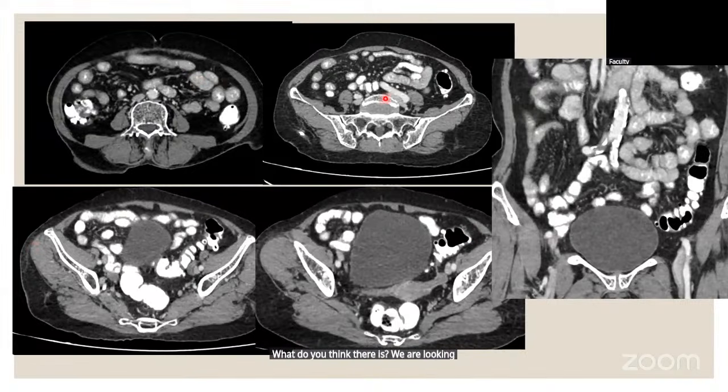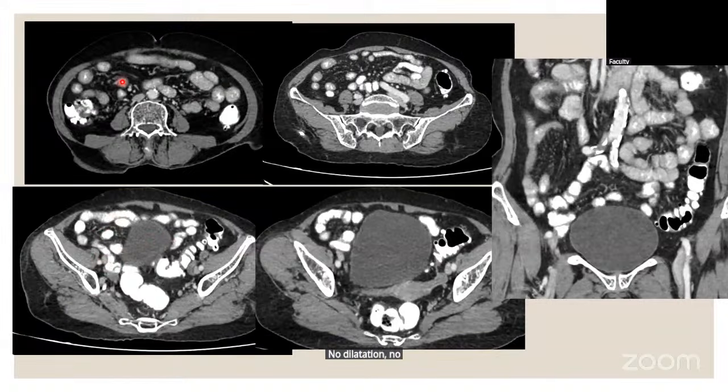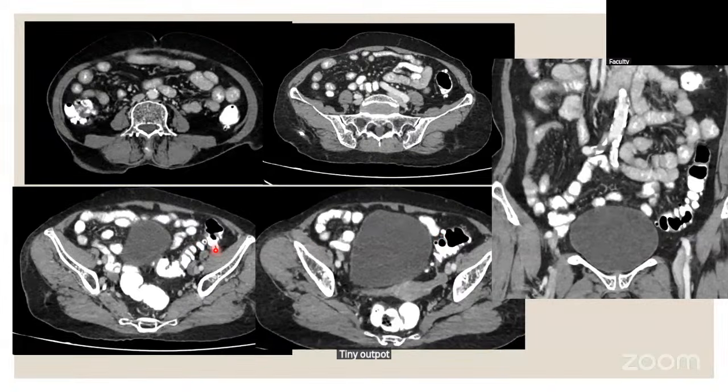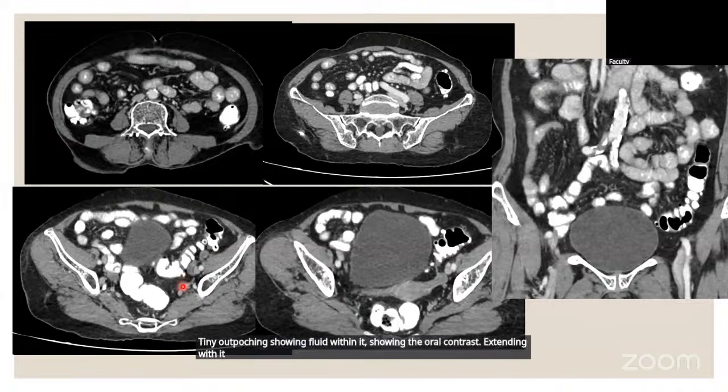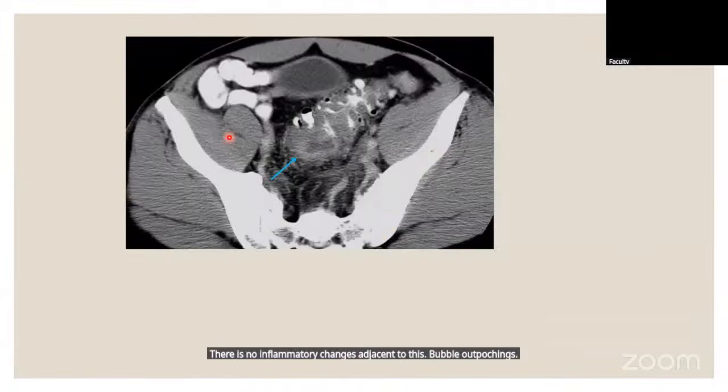We are looking at the small bowel loops, they are looking normal, no dilatation, no wall thickening, there is no fat stranding. Look at the colonic loop. If you observe the colonic loop, there are multiple tiny outpouchings showing fluid within it, showing the oral contrast extending within. This is nothing but diverticulosis without inflammation. Inflammation of a diverticulum is called diverticulitis. This is diverticulosis because there is no inflammatory change adjacent to these bowel outpouchings.